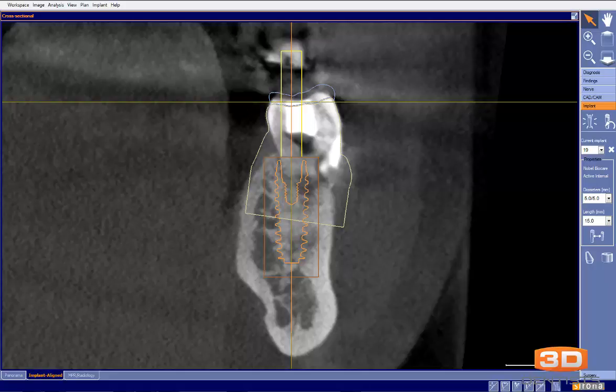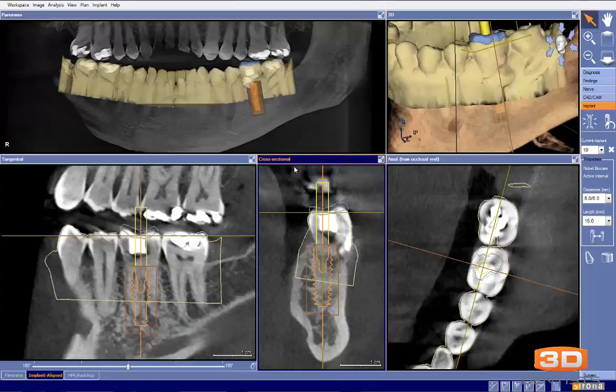In looking at this, my assessment based on this scan is that our buccal plate goes to right there. Our bone level for our buccal plate is right there. Our bone level for our lingual is right there. So we have this angulation right here that is going to create some predictability issues. Is it possible to place this implant and graft over the top? Absolutely. The question is going to be predictability of whether or not that will be able to be maintained and not have threads exposed.